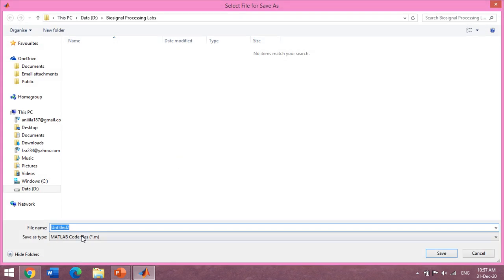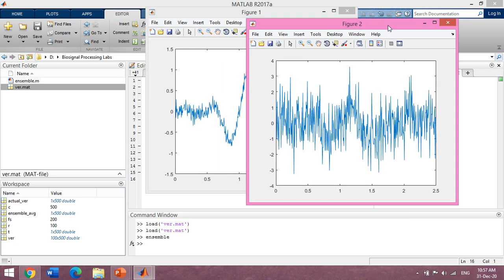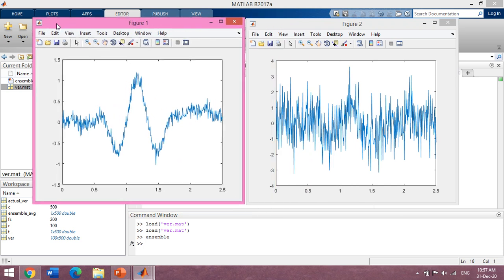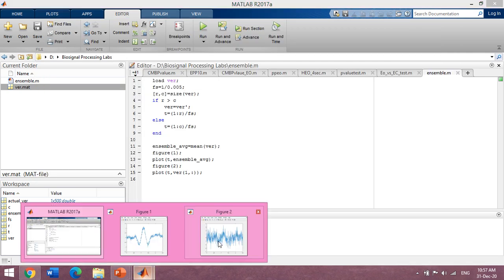Now run this. Now you can compare two figures.